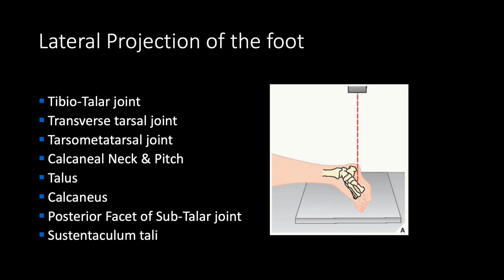It's difficult to appreciate some of the fractures that may be in the foot with this, because they overlie each other. But you should be able to look at the arch and some of the more midfoot areas that may be of concern.